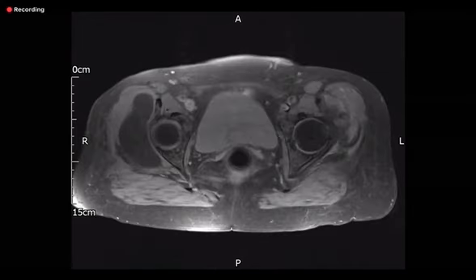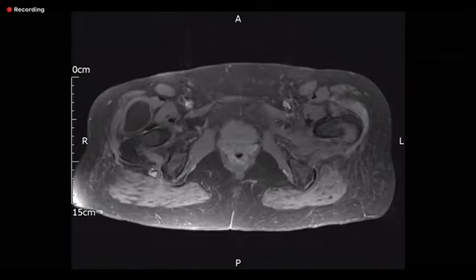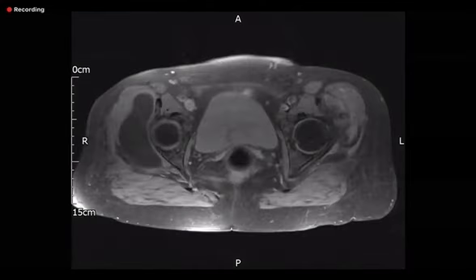So what kind of sequence is this? This is a fat suppressed T1. Just to make a point, because of time factor, I just want to crack on. So that lesion suppresses. Just give me your final opinion on the lesion on the right side. How are you going to tackle this? I think this is a lipomatous lesion within the muscle. It doesn't have aggressive features, but this would still need a biopsy to ensure there's no malignant tissue within it. So I advise that to the clinical team, and I advise that to referral.